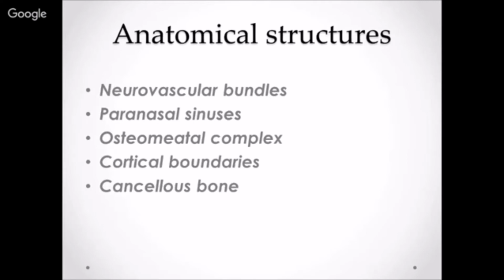The cancellous bone is much more in terms of quality of the bone. So within the cancellous bone, you would be looking for a few things, and as we go through, we will come to it. And this indicates the quality of the bone. It is critical to not overlook the cancellous bone and the cortical bone for one main reason, because the traditional methods of density of bone are not applicable when it comes to CBCT imaging.